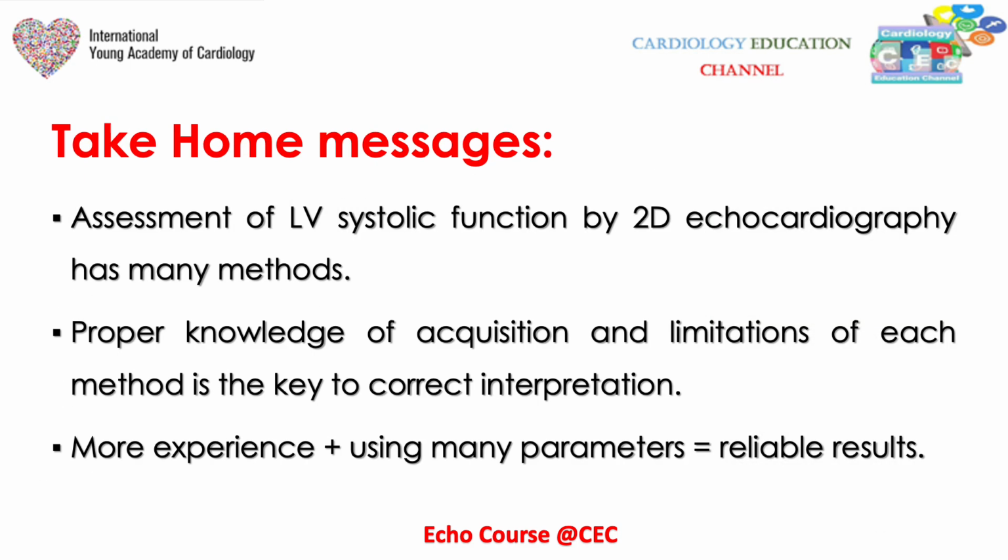So my take-home message after this is that the assessment of LV systolic function by 2D echocardiography has many methods, and proper knowledge of the acquisition and the limitations of each method is the key to correct interpretation, and more experience plus using many parameters gives you reliable results.